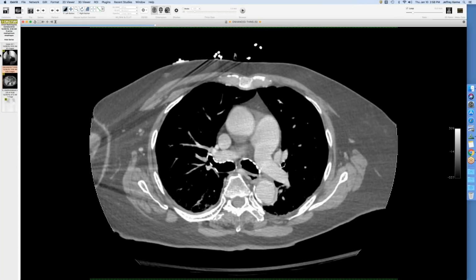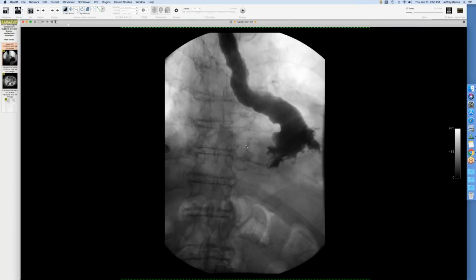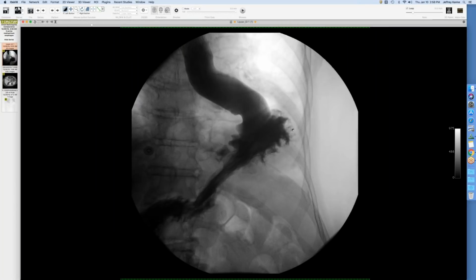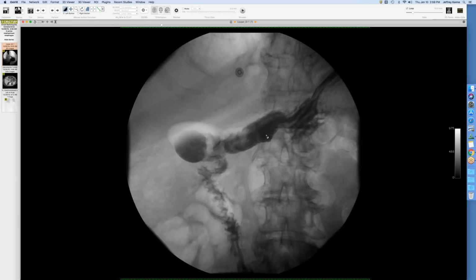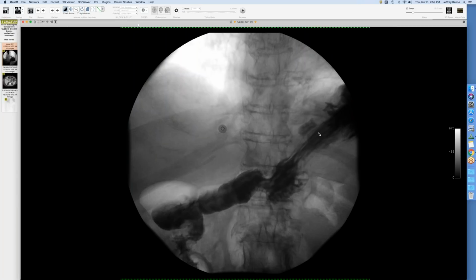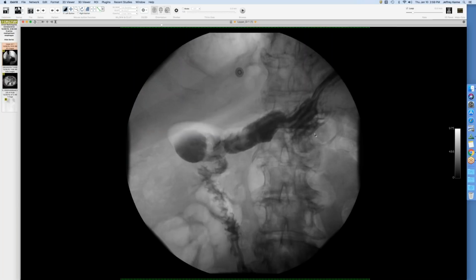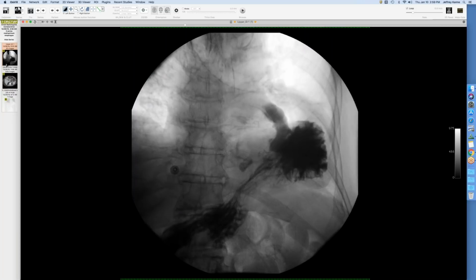And the CT, unfortunately, doesn't do as much justice, but we have a beautiful fluoroscopic study here. And let me show the image right there. So here's the intrathoracic, dilated esophagus, and then there's your ulcer that perforated. This was a culprit ulcer with a little bit of contrast coming out right there. So not something we used to look for years ago on upper GIs with these ulcer diseases, but this is one that is, even though it's a stomach, it's in the chest, but just a nice case of that. So they repaired this with a patch.